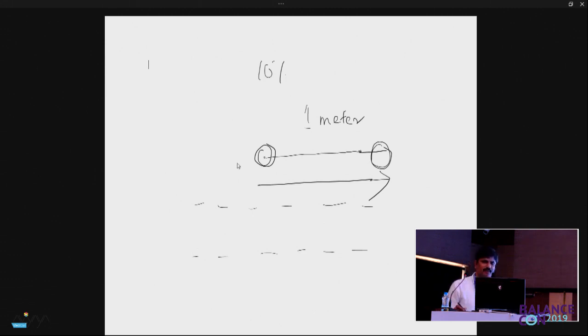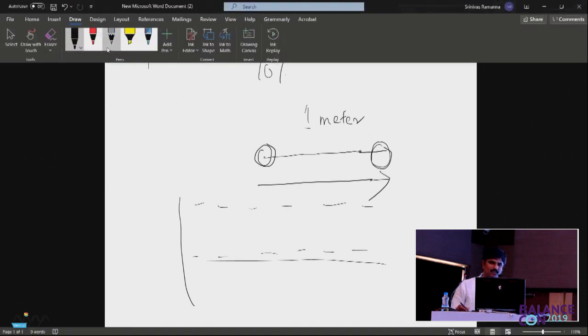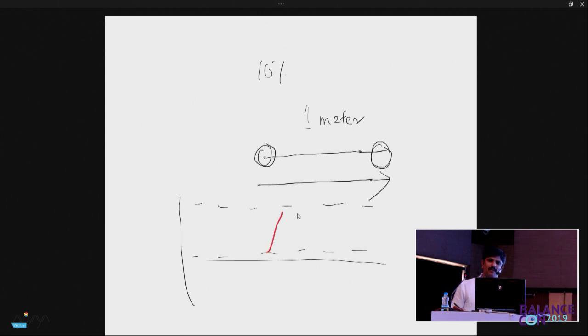Yes. So now if I am writing this as a VNG trace, this is the VNG trace. This is the point of beginning. This is the end point of the target. Now the eye has to move from that place to this place, but it did not reach, it fell short. So the eye starts from here, falls short, then is not moving for some time. And then it makes a final further correction and reaches the target and stays there. Is that how hypometria will look?